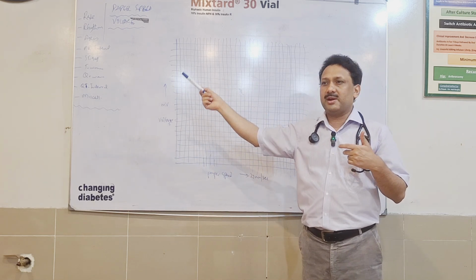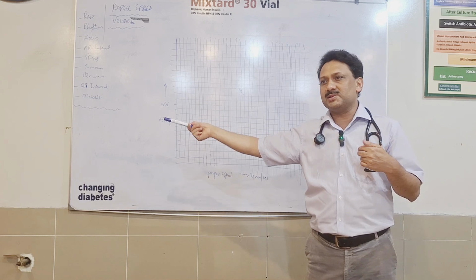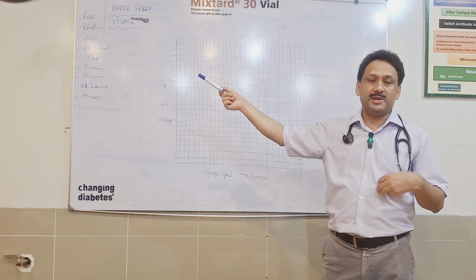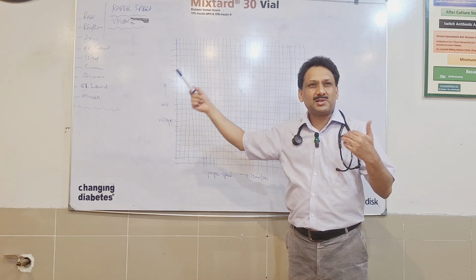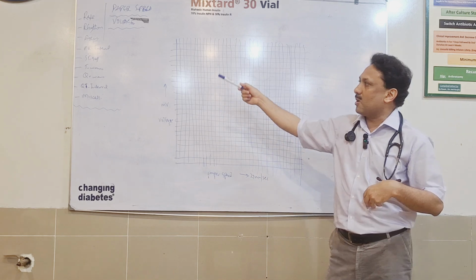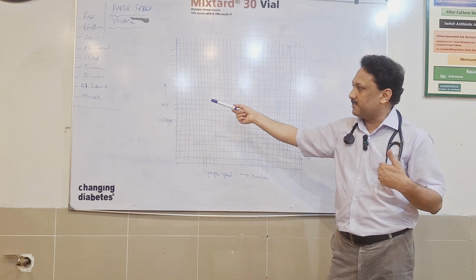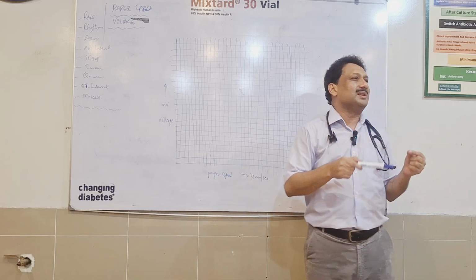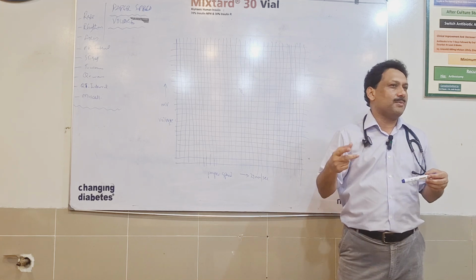We have discussed arrhythmias in detail. Then axis. I have told you about the axis earlier as well, that we will be using two rules: one is the thumb rule and the other one is the paper method. Then PR interval, from the start of the P wave to the start of the R wave. And then ST segment, T wave, Q wave, which we discussed in the previous session, and QT interval. Similarly, a few miscellaneous things, including U waves and electrolyte abnormalities.